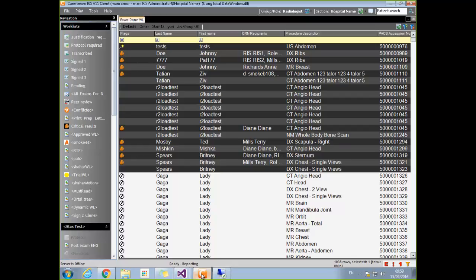Chatting with the person would not give them access to any functions inside the RIS that they wouldn't have. So that nav bar is a real nav bar. Yeah, if they don't have access to that action, they won't have access, it's only the name of the action, the patient name, which they can get off the work list. So that's not tied in with VIP and with patient consents in any way?